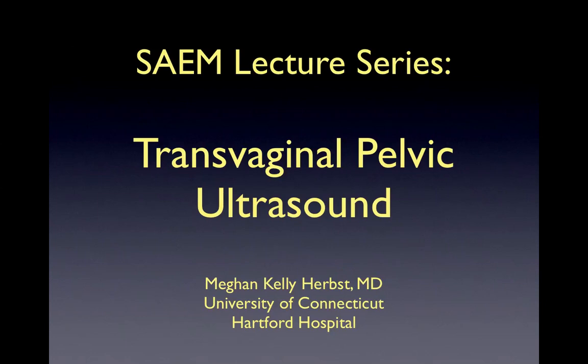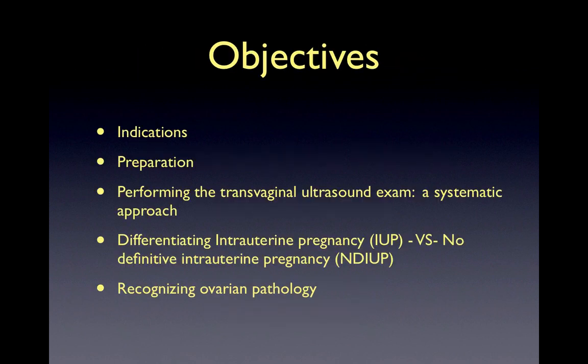Hi, my name is Megan Kelly Herbst, and I'm going to be talking about performing and interpreting transvaginal pelvic ultrasound. We will be covering the indications, preparation, and a systematic approach to the transvaginal ultrasound exam, and then I'll discuss how to differentiate an intrauterine pregnancy from no definitive intrauterine pregnancy. At the end, there will be slides on ovarian pathology, which is important to recognize but beyond the scope of emergency physicians.